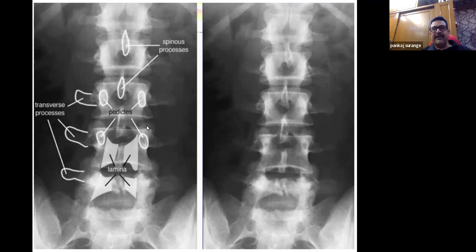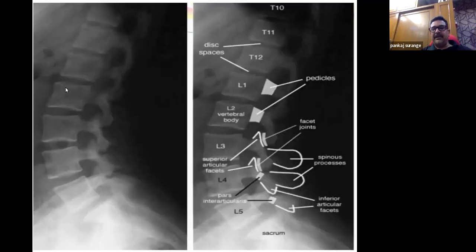That has already been covered in the fluoroscopic anatomy. In the lateral view of the X-ray, we see the vertebral bodies and intervertebral disc space. We see the pedicle. Now we cannot see the transverse process; what we see is the shadow of the transverse process. And if you follow this pedicle over here, we see the inferior articular process.